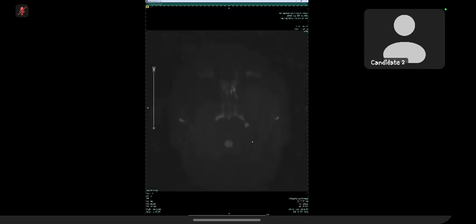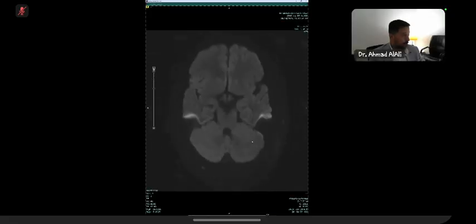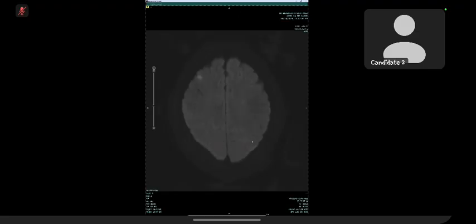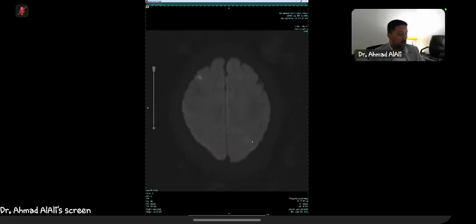Right. So this is in the territory of the right MCA, you said, right? Yes, I will inform the stroke team for the further management of this patient. Okay. So any further imaging that you'd like to add to the patient?